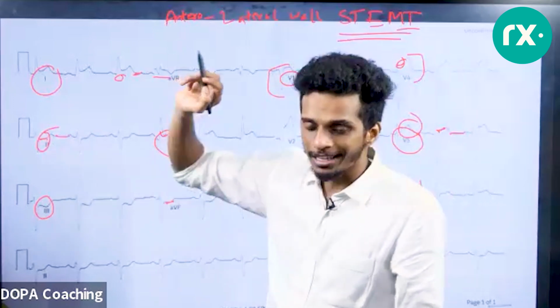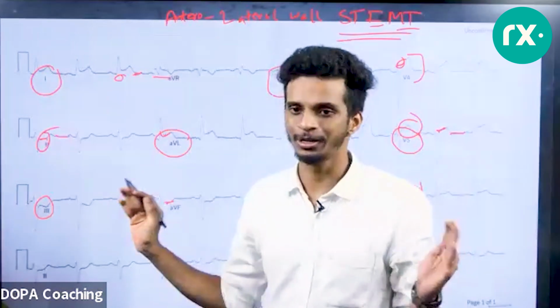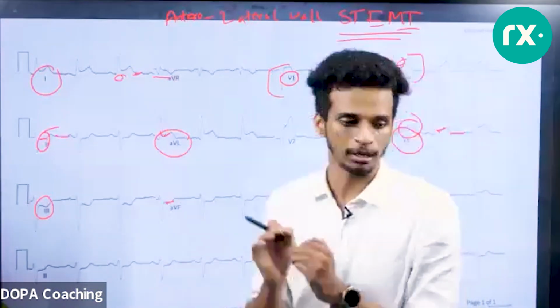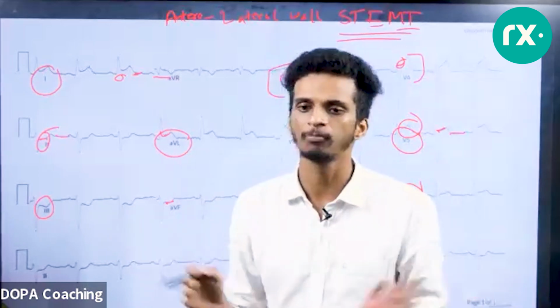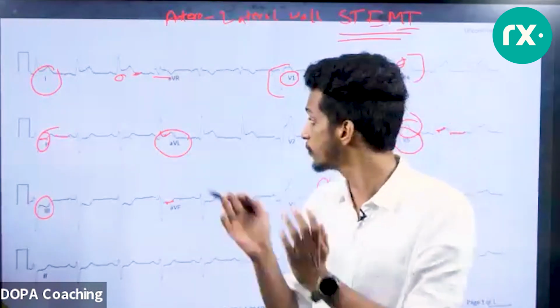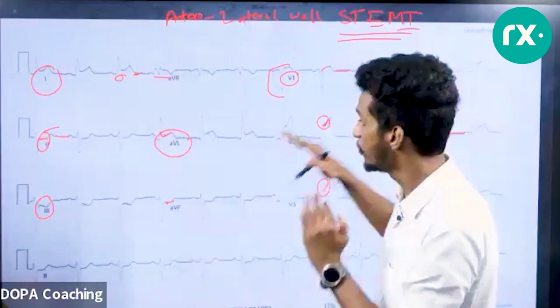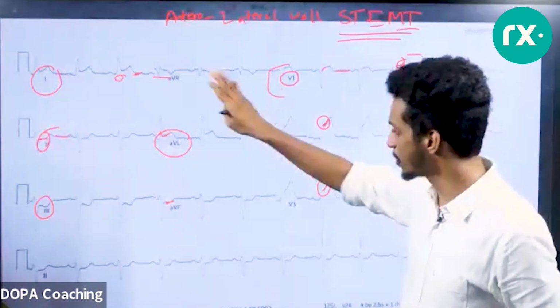So there are ST depressions in lead 2, 3, and AVF. Those are called reciprocal changes. I am actually not going into that level now because it's already 10:05. I am planning to wind up at least by 10:15 p.m. and I just need to take your questions and we'll be winding up by 10:20. The rest we can discuss as a separate session, if you find it helpful, because even in this single ECG, I have not mentioned all the findings.